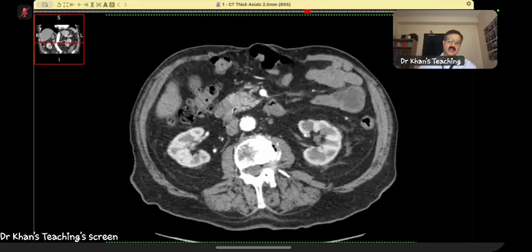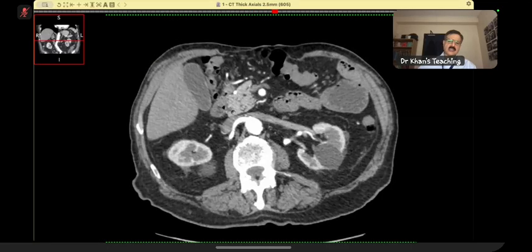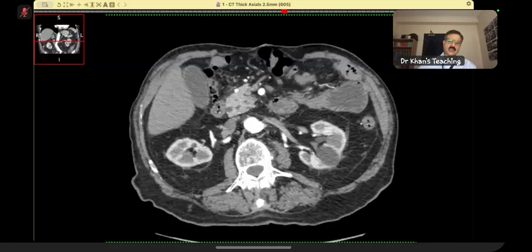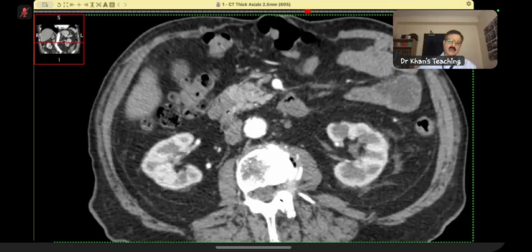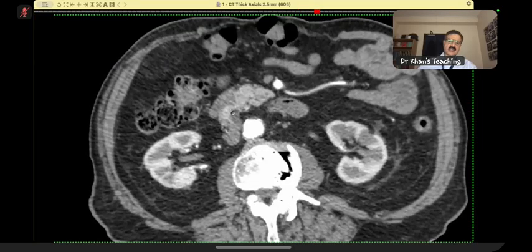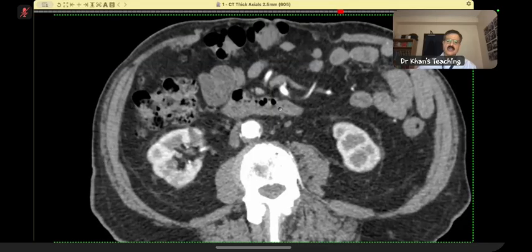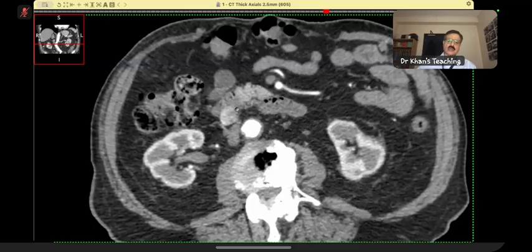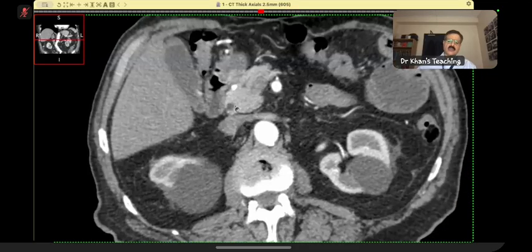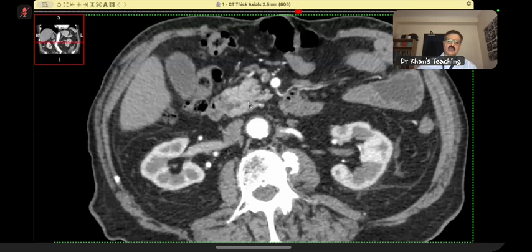This is the head. Now, look at the duodenum. This is D1, this is D2. This is the CBD where I am pointing. The pancreatic duct comes here, and you can see it joins the CBD. So this is the ampulla, still the duodenum, and this mass is sitting here. Just concentrate on the duodenum. The duodenum goes and gets connected with D3. So the mass is sitting outside the loop of the duodenum. But this area is the classical gastrinoma triangle. I've shown you this picture from Radiographics quite a few times. You can Google it, a good picture which tells you that all of this area, including the area where our tumor is, is known as the gastrinoma triangle. So this word was not coming to your mind.